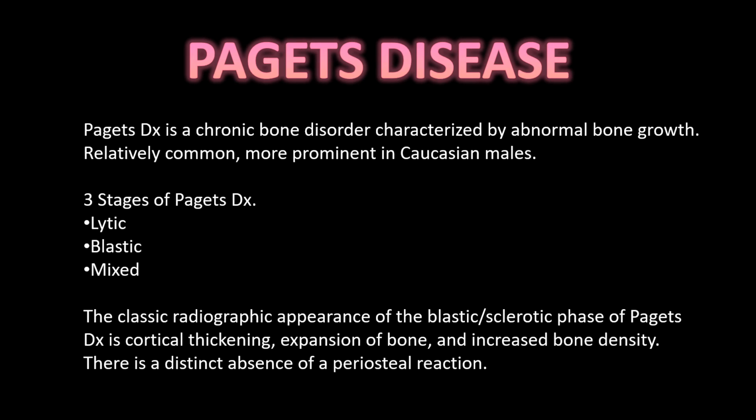Typically on an x-ray, the blastic appearance is more commonly seen, which is what we saw in this case. And the classic triad of cortical thickening, expansion of bone, and increased bone density were also seen here. And there's a distinct absence of periosteal reaction seen with Paget's disease.